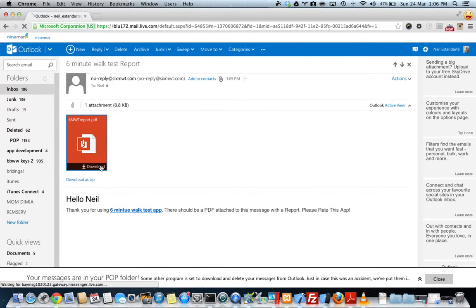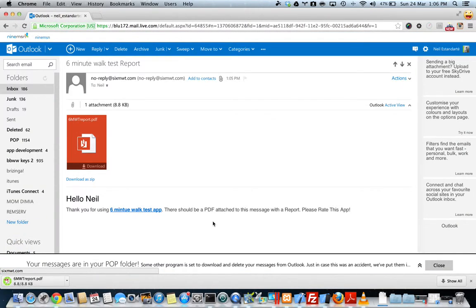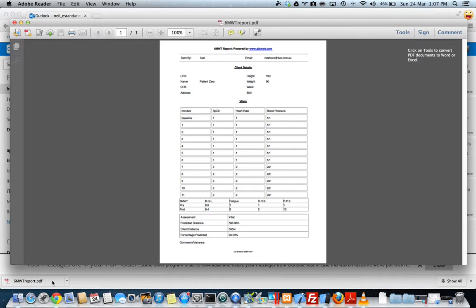Alright, now I'm going to download it. So it says, hello Neil, thank you for using 6-Minute Walk Test app. There should be a PDF attached to this message with a report. And I'd really like you guys to rate this app. I've had a couple of constructive criticisms, which has been really good, so keep them coming guys. I'm always up for improving this app.